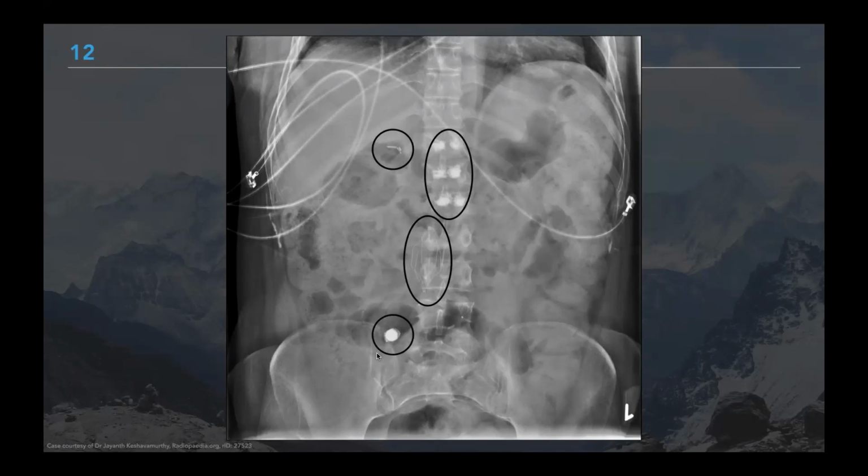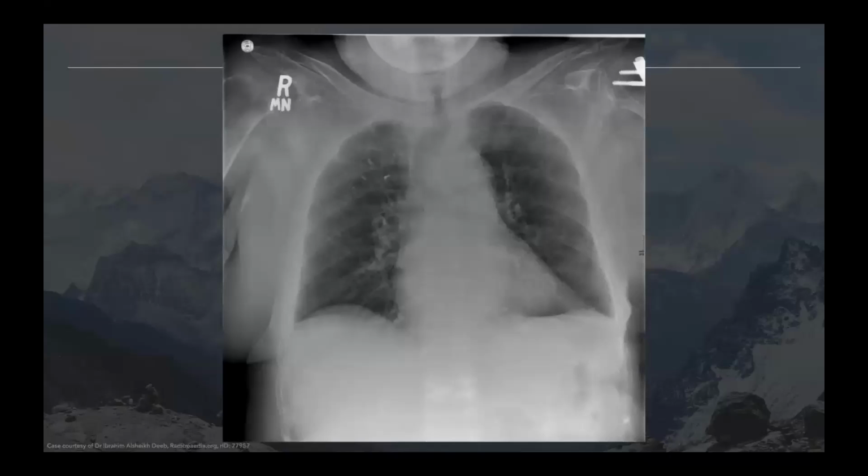You will rarely see these, but there are lots and lots of weird and wonderful things that can appear. It's probably less complex than chest, where there are all sorts of weird Swan-Ganz lines and mad stuff you can encounter, but it's just worth seeing these once so that you know what they are. Okay. And you should be aware that you can also see these on chest x-rays.